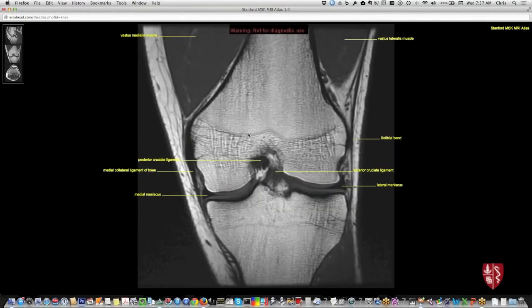My approach has typically been to go through the coronal scans systematically, then move to the sagittal scans and then the axial scans to finish up. The rationale is that I don't like jumping around between different series. I like to look at one series, or one imaging plane, focus on as much as I can, and then go to the next plane to reinforce that information. The final plane can show other things that maybe weren't visible on the first two planes, and helps refine and finish up the case. So that's the general concept.